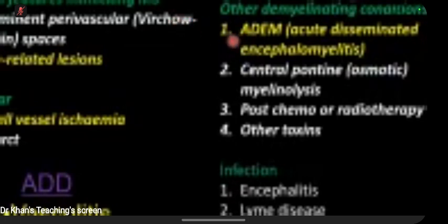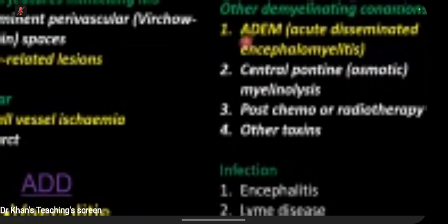So in the real world, you will always consider this in your differential. Part of the differential is clinical, which we will learn. But please remember that radiologically speaking, there are differences, and these differences will be asked in the exam. So I'll show you cases highlighting the differences.